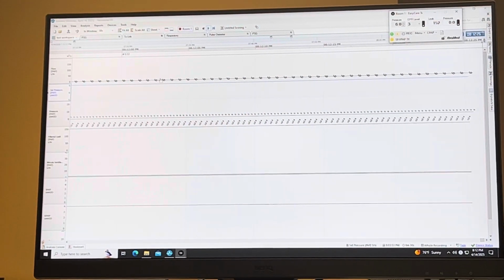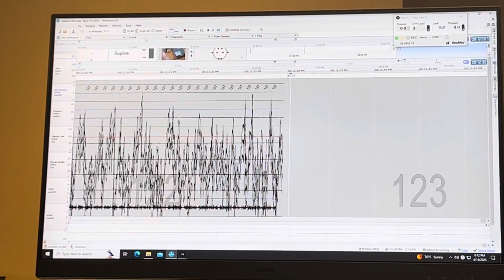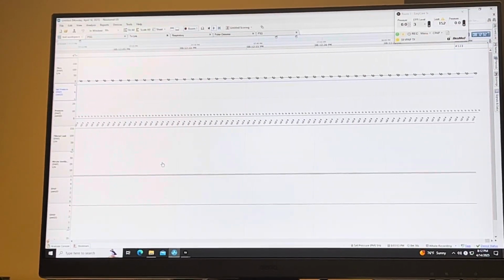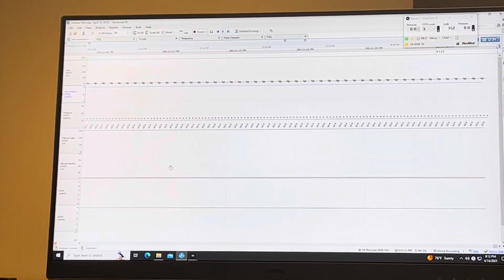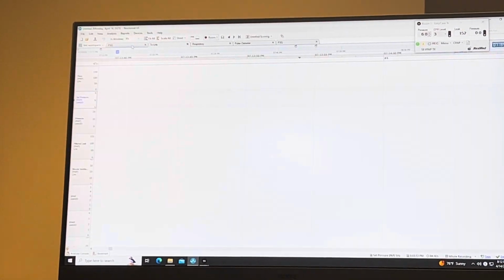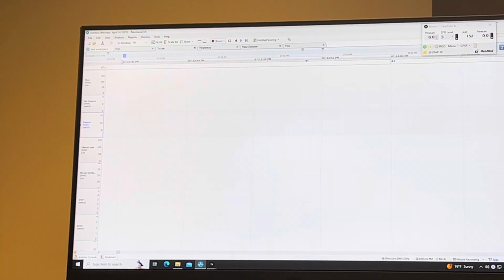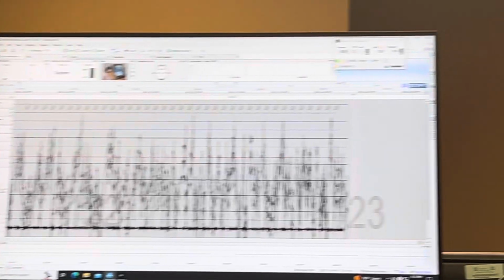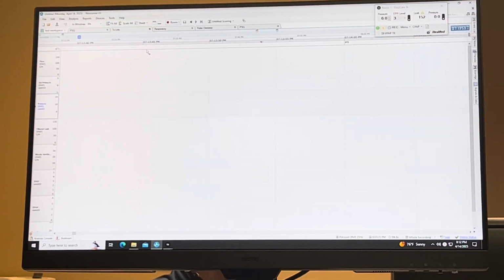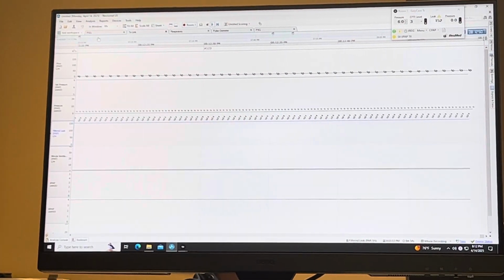And so when we go through and make those sheets, we'll have a PSG and a package. And then from there, you can edit things and save it as your own. But I always recommend having both of those pulled up. That way, if the patient happens to split and you weren't planning a split, you already have all the signals available. You can put it on once the study starts too.